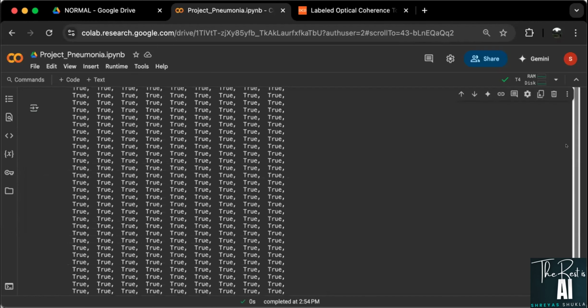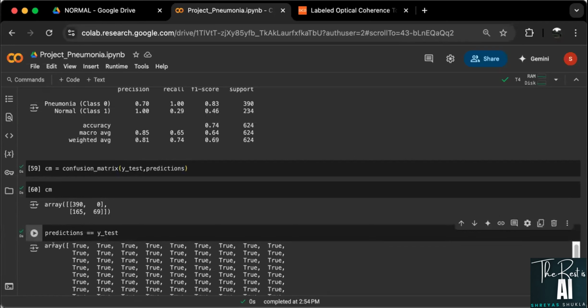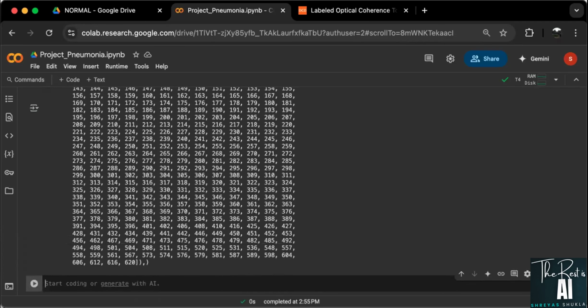Now what I want is, let us first grab this, because it is going to be a 2-dimensional array. So what I'm going to do is put this as np dot nonzero. And if you run that, you will have this bunch of values over here.